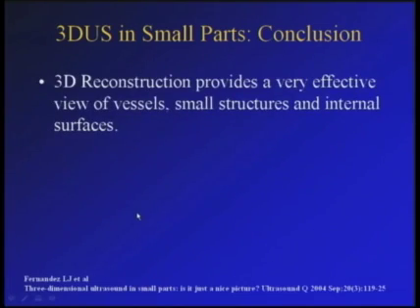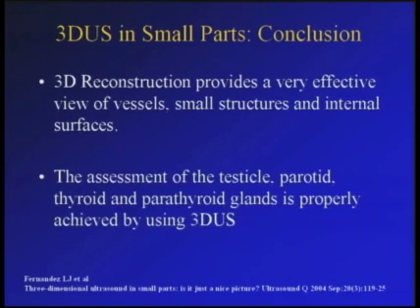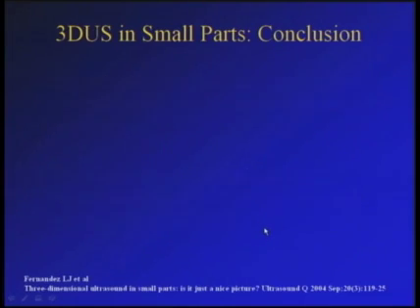So in conclusion, three-dimensional ultrasound and three-dimensional reconstruction provides a very effective view of vessels, small structures, and internal surfaces. The assessment of the testicle, parotid, thyroid, and parathyroid gland is properly achieved by using 3D ultrasound.